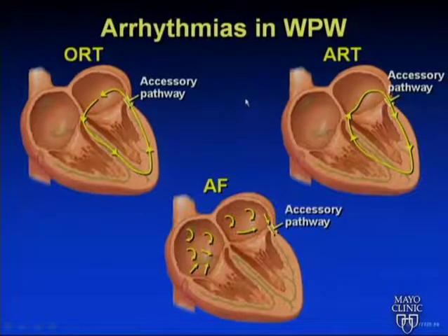Couple of intracardiac tracings in other SVTs. And again, we'll cover the mechanisms of this SVT in detail later today. But patients who have, instead of just the AV node as a connection between their atrium and ventricle, have an accessory pathway. Remember, in the normal heart, the whole annulus is insulated. The only way to get from A to V or V to A is through the AV node. But folks who have this accessory pathway, it's like a little breach in the insulation. And when you have that, that sets up the possibility of some tachycardias.